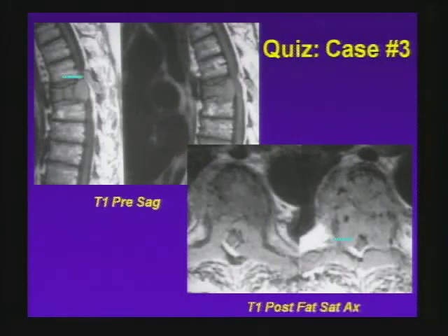Yet the cortex is still there, and there's not that many types of things that will blow out a vertebra like this. Infection, unlikely. Infection would be very quick. This has been going on for a long time. I can tell you there wasn't a lot of infectious type enhancement here. The anterior longitudinal ligament looks pristine. Not osteoporosis because all the marrow is affected. So this is a tumor. It's a neoplasm. And in fact, you could even go out on a limb and say it might be a plasmacytoma because of its expansile appearance, or renal can do this too.